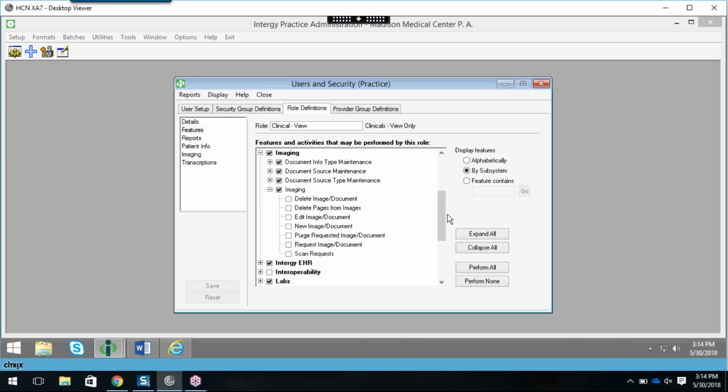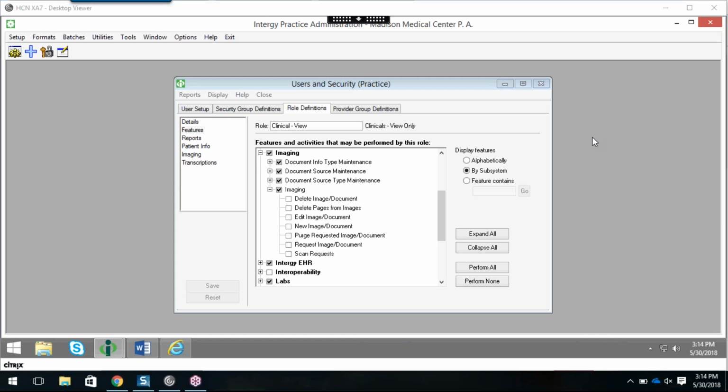As far as deleting goes, in security, we usually try to stay away from an end user having deleting rights. That's usually the overall golden rule for security. But when it comes to deleting a document, we might need to be a little bit more lenient with that. As a reminder, the user might accidentally scan into the wrong patient, and we want to give them that capability of deleting in that sense.